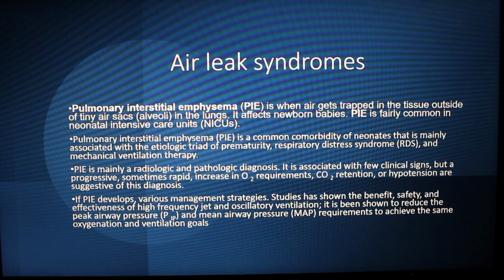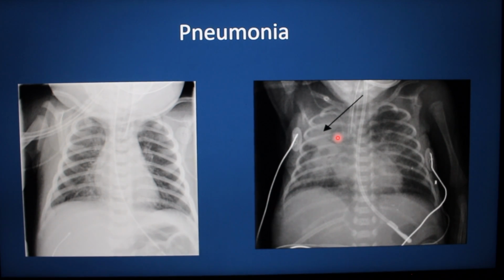Now we talk about air leak syndromes. So there's two types of air leaks. One is, it's in good position.